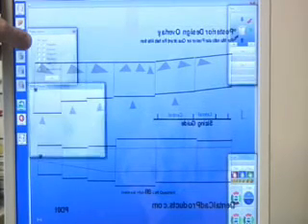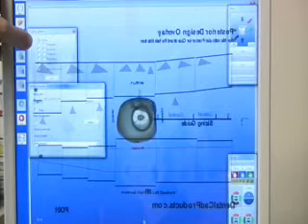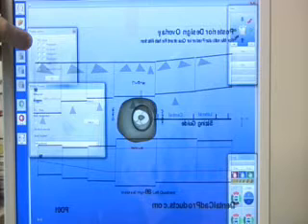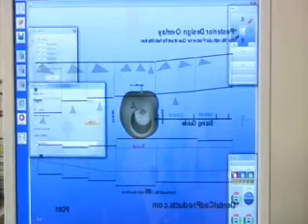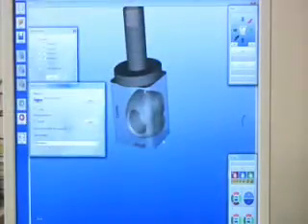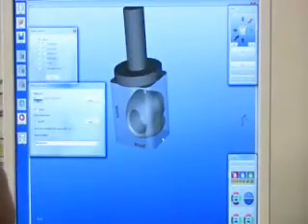It'll create a cylinder. You can see it looks like it will create a cylinder all the way through, but in actuality it only goes about 90%. You'll have to finish with hand milling. It is a big help though, because the manufacturer recommends minimizing the amount of hand milling after the Emax comes out in the milling chamber.